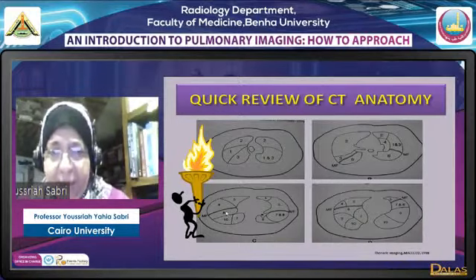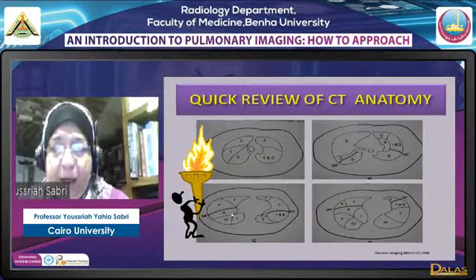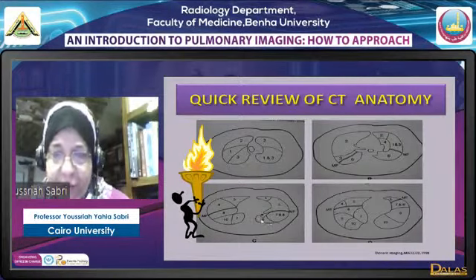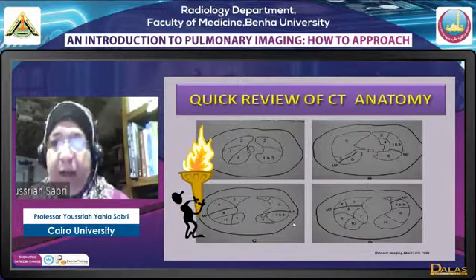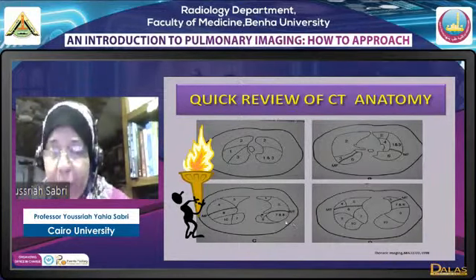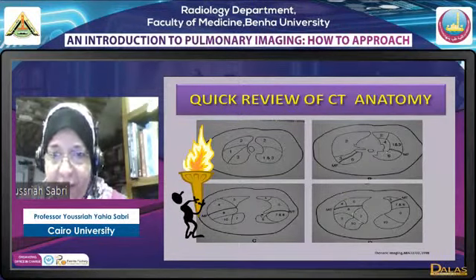know. anterior basal هتبقى قدام، والposterior basal هتبقى ورا، والmedial basal in the azygoesophageal recess. Here we have the anterior basal and the posterior basal. طب where is the lateral basal? We have said من ال PA film ان اللاترال بيزل موجوده في البلورال ريسيس، فهتبقى تحت شويه، هتبقى اول ما يبان البلورال ريسيسز هيبقى عندنا هنا anterior basal, posterior basal, medial, lateral basal اهي بتبتدي تبان تحت، وهنا عندنا anterior basal, posterior basal and lateral basal. يبقى اللاند ماركس بتاعتي هي الايرواي والكونفيجريشن بتاع الهارت.